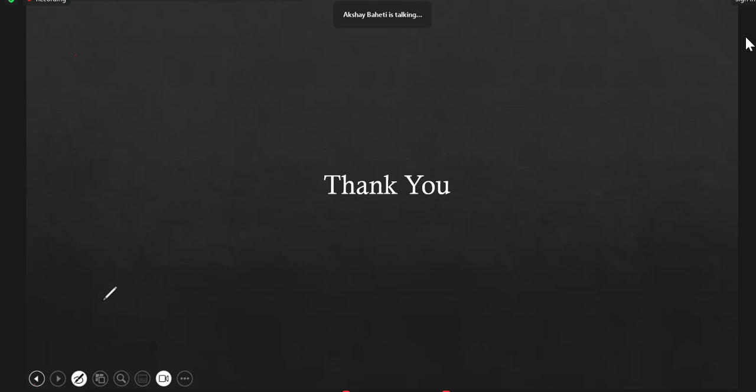Bethlehem is asking, is there a cutoff to say mediastinal widening? What is your subjective take on when do you call it mediastinal widening? Mediastinal widening again has some mathematics to it. It's the right paramediastinal border and the left paramediastinal border, and then there is some measurement. It's given in Sutton, and that should be followed. There are some millimeters plus minus so and so in male, and some millimeters plus minus so in female. It is given in Sutton, in the normal chest X-ray or mediastinum, the first chapter or the mediastinal chapter. She can check it.